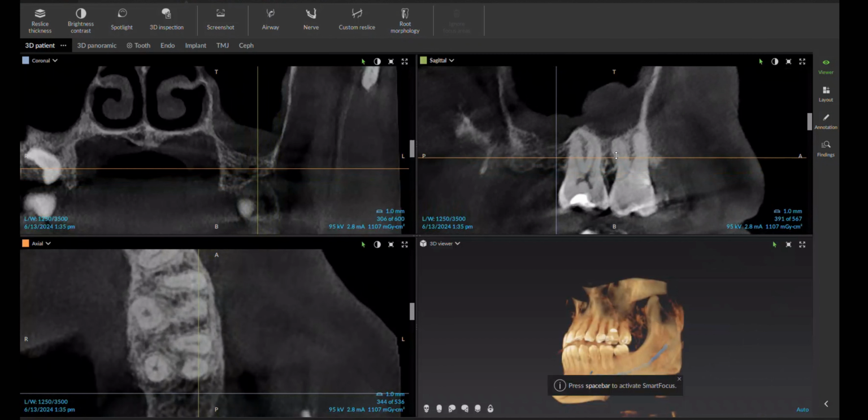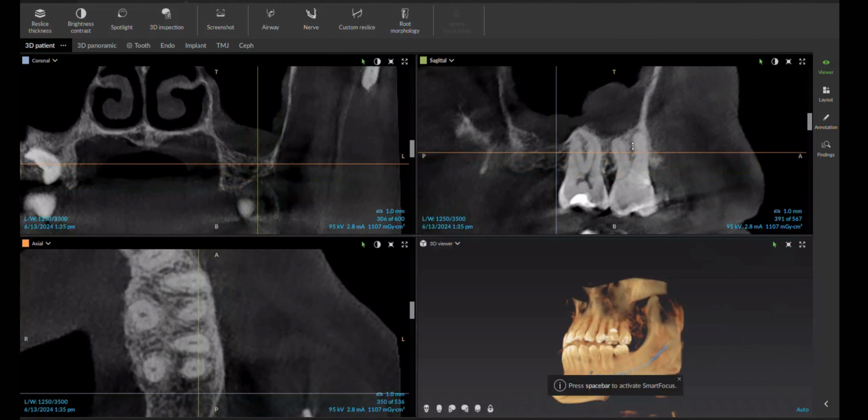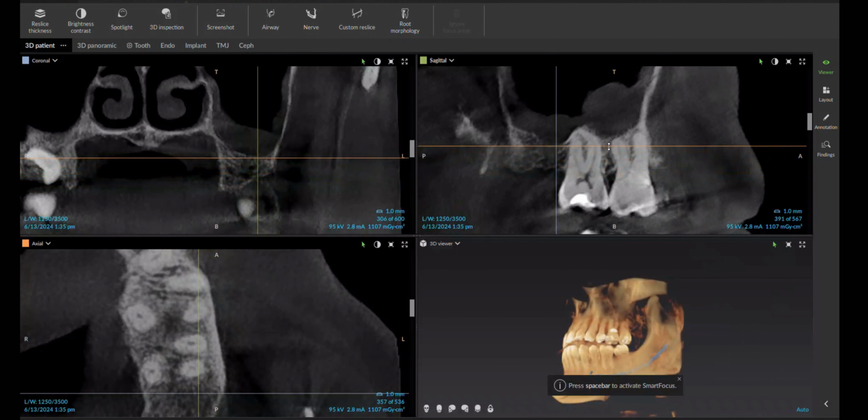And I'm looking at this right here. So this is the distal aspect of the mesiobuccal root of number 14, which is this area right here. This is where my eye is, but I'm coming over here to scroll. And I see this radiolucent area here, but I see a lamina dura of the PDL. I still see trabeculation inside of this area here. So I'm going to chalk this up to an artifact or just an anatomical aberration and not something pathologic. So we can dismiss that.